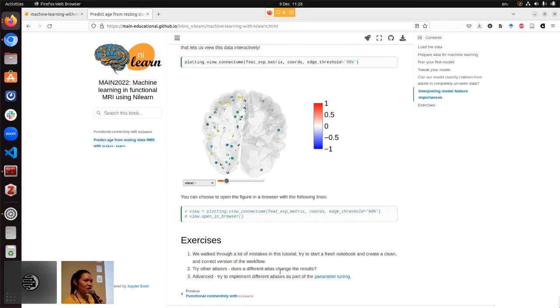The second thing is, I have briefly talked about the problem of this atlas. Maybe one simple solution is to find a different atlas that has isolated parcels for each dimension, and that'll be easier for you to understand. So you can maybe find another atlas to try that.